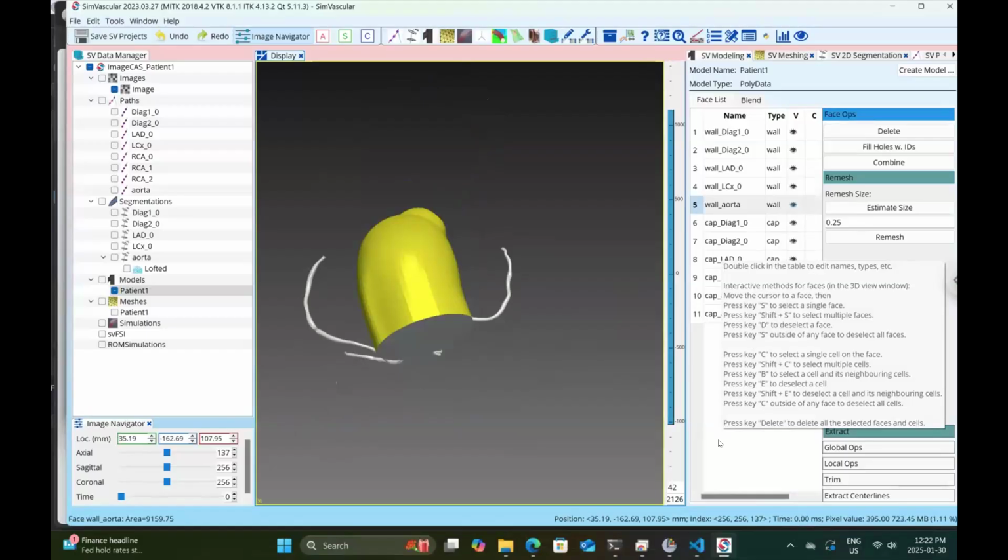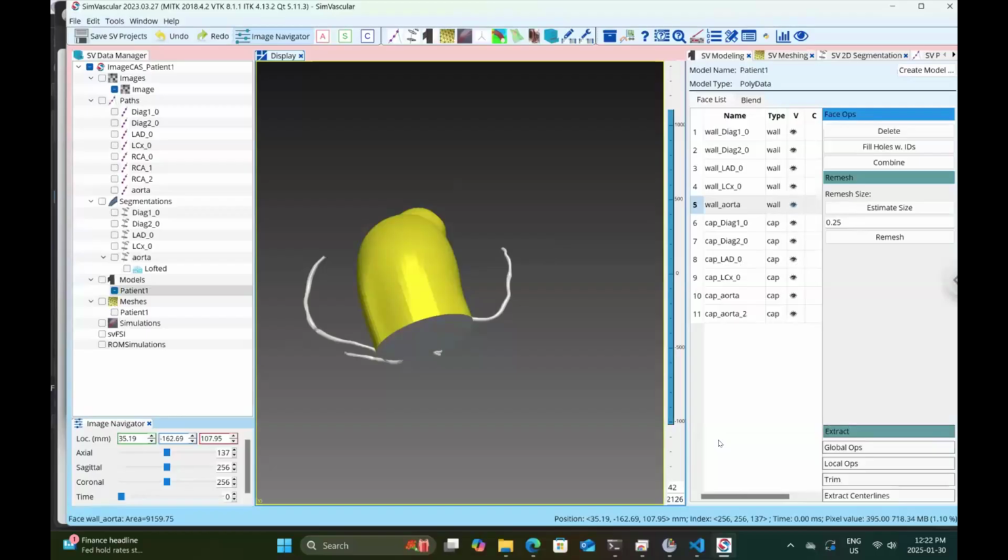Okay, so we have the LAD, we have the aorta, and they can do the right coronary artery. I think, what else do we want to teach them? Are you all okay with segmenting the right coronary artery, or do you want us to show how to segment the right coronary artery as well? Any thumbs up for right coronary artery? If none, then we can move on to other stuff as well. I think I'm good to move on, but if others want, we can do it.